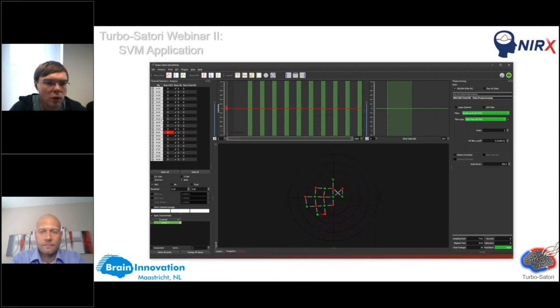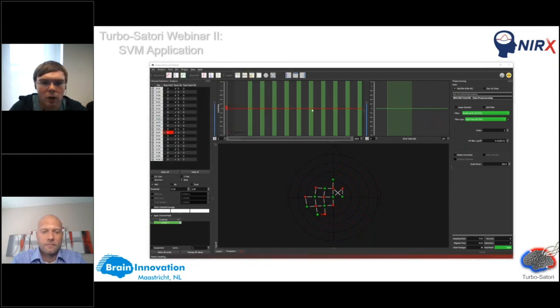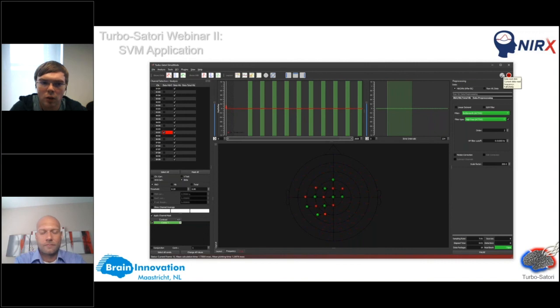But you also see here that the channels are marked with a C. This channel uses the confound predictor, so you should expect different values for these marked channels. And you also see a little warning over here, just to not make a mistake. So using a localizer will provide you with the information that you need to decide on this value.